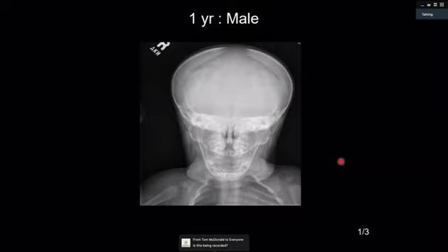Thickening of what? Thickening of the skull table or is it projectional? No, forget about it. Anything else? I'm looking at the clavicles. Excellent. They seem to be not well formed. Very good.